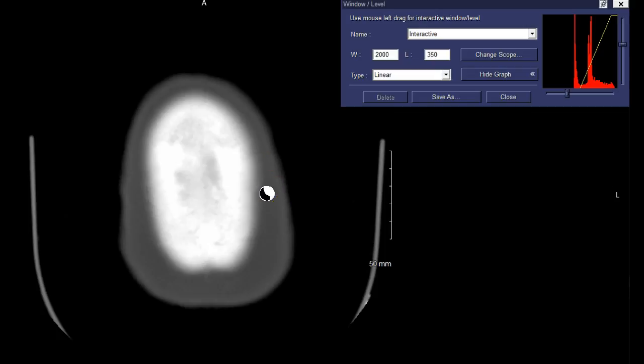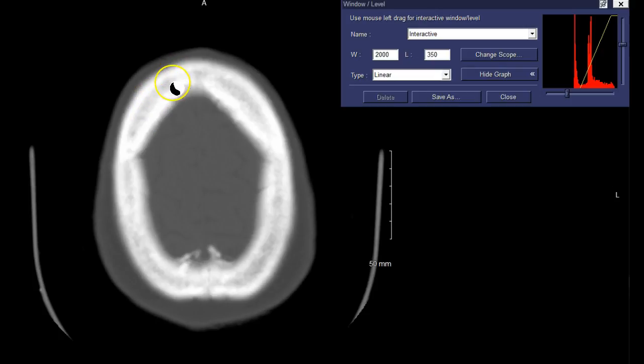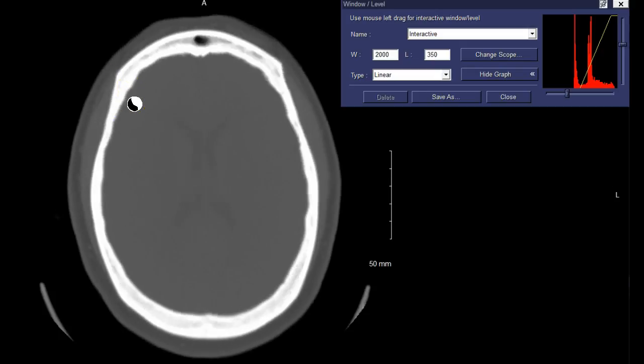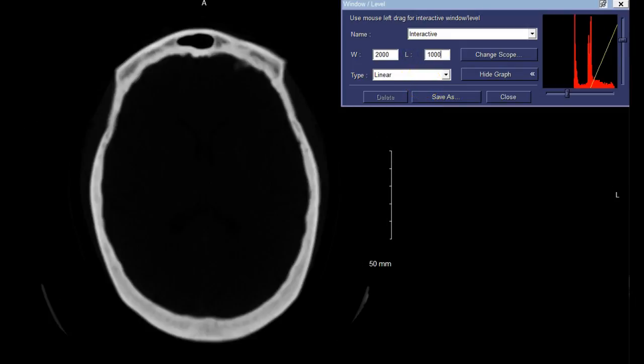As we go basically through the skull, you're able to visualize the bony trabecula or the diploic region within that bone. We can definitely visualize that. So you also can see some bony-based articulations here. So just to reiterate, let's show you what 1000 looks like.